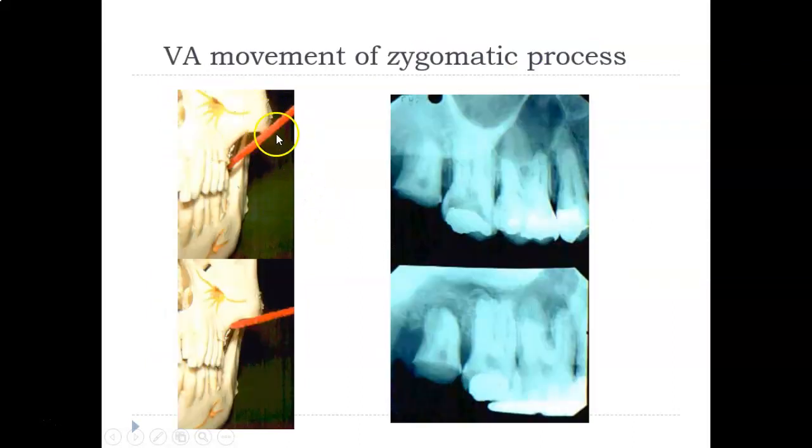So we can use something like the zygomatic process, which is very, very buccal. So here is a very sharp downward angulation, and so you can see how low the zygomatic process is in the picture. You can see a lot of it because the BID was at a sharp vertical downward angle. So it also brought the zygomatic process down into the image.